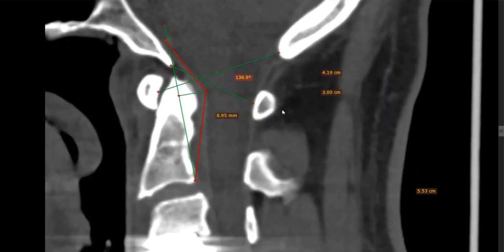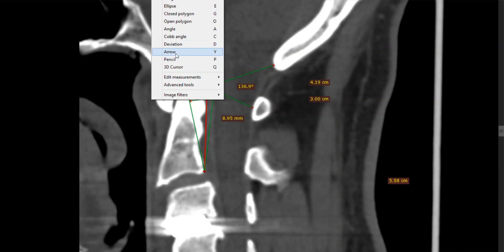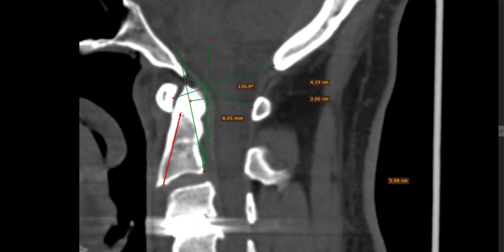So, okay, now that that's logged, now we're going to take a look at the relationship of your skull to C1. I'm sorry, your skull to C2. So I'm going to take this and copy this since it's already there at the base. Bring it right out to here, and then we're going to take a look at that soft tissue. Now this, it's normally looking for what C2 is doing to the brainstem, as well as C2's relationship with the skull. So some people's C2s retroflex backwards and they press into the brainstem, and that's where this pannus, this swelling, can happen.